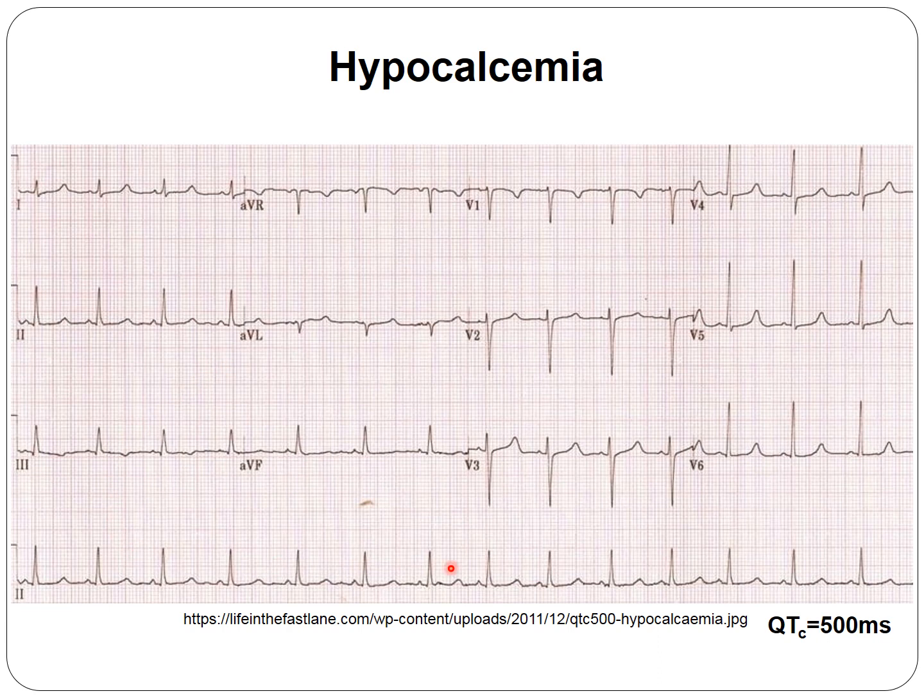The rhythm is regular. The heart rate is normal, around 90 beats per minute. We do have sinus impulse formation. P is positive in lead 2, negative in aVR. PR is normal. QRS is narrow. The axis is normal, around 50 degrees.